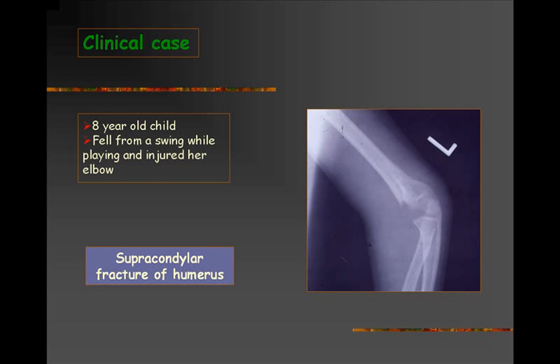In all cases of fractures, one looks for associated neurovascular injuries. When one sees an X-ray such as this with a prominent beak or sharp end of the bone, one must look for the associated nerve or vessel injuries that are anatomically close to it. In this particular instance, one should look for brachial artery injury.